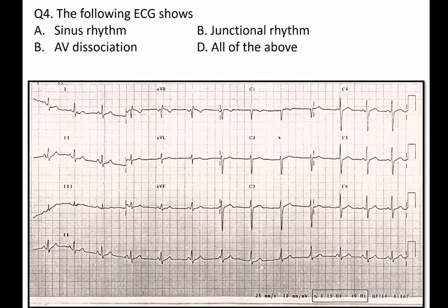Since the QRS complex morphology is the same, this is a junctional rhythm, but it is a little faster than usual junctional rhythms should be. So we call it an accelerated junctional rhythm, occurring at a rate of say 75 beats per minute, and the sinus rate is also nearly the same, 75 beats per minute, and you find that the six beats in between have AV dissociation.